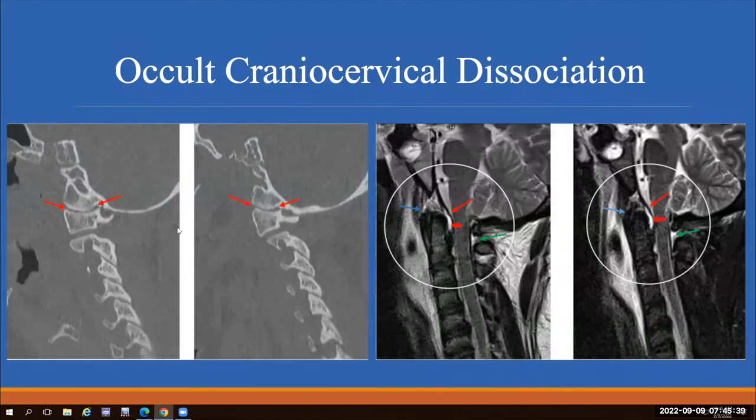I'm still suspicious there's significant injury here. So the goal is to use the soft tissue windows on the CT to help guide you into what patients, even if they have normal joint spaces, may still have underlying ligament injuries on MRI. So it can be very difficult though, for sure.